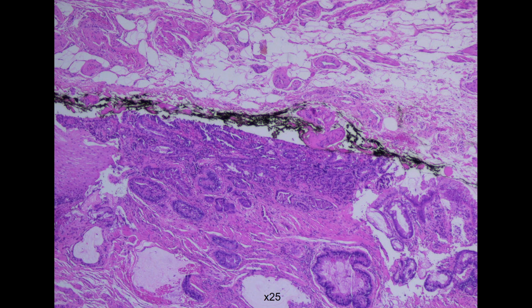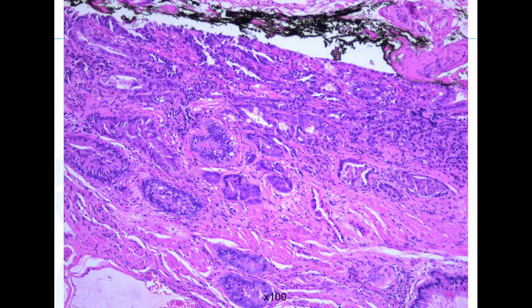So basically what you see is crowding of glands in this area here. And I would also like to point out these horizontally arranged glands that are filled with some material here. This is the muscularis mucosae. On higher magnification, you see the crowding, and also you see that these cells are highly atypical.